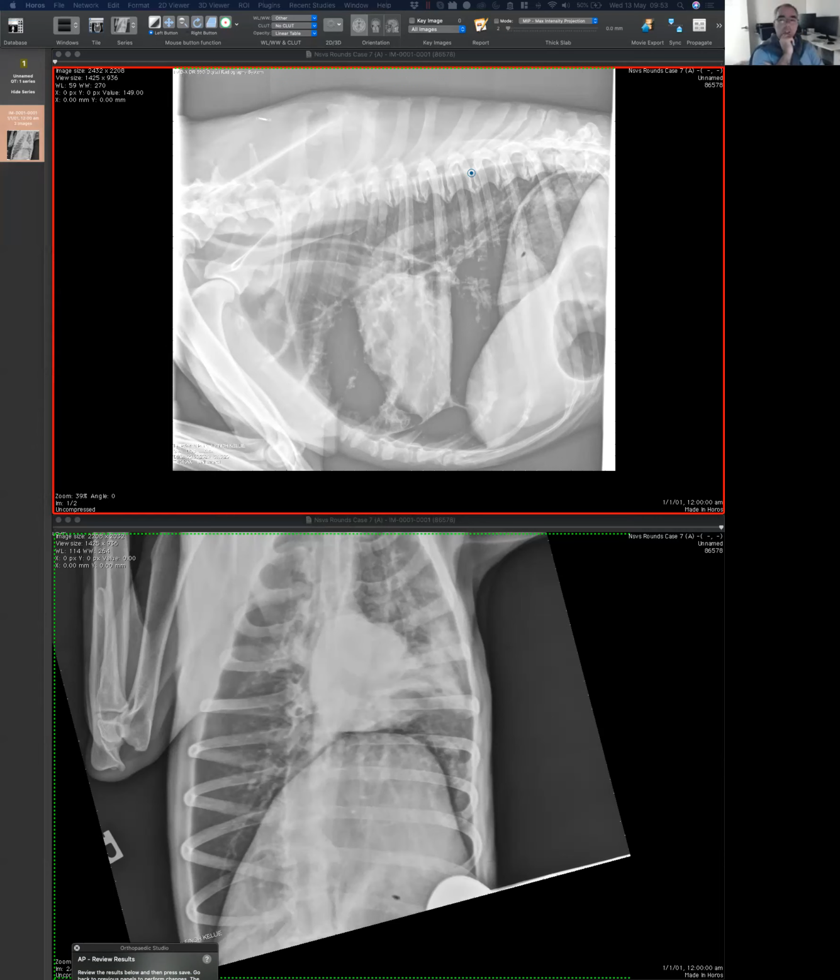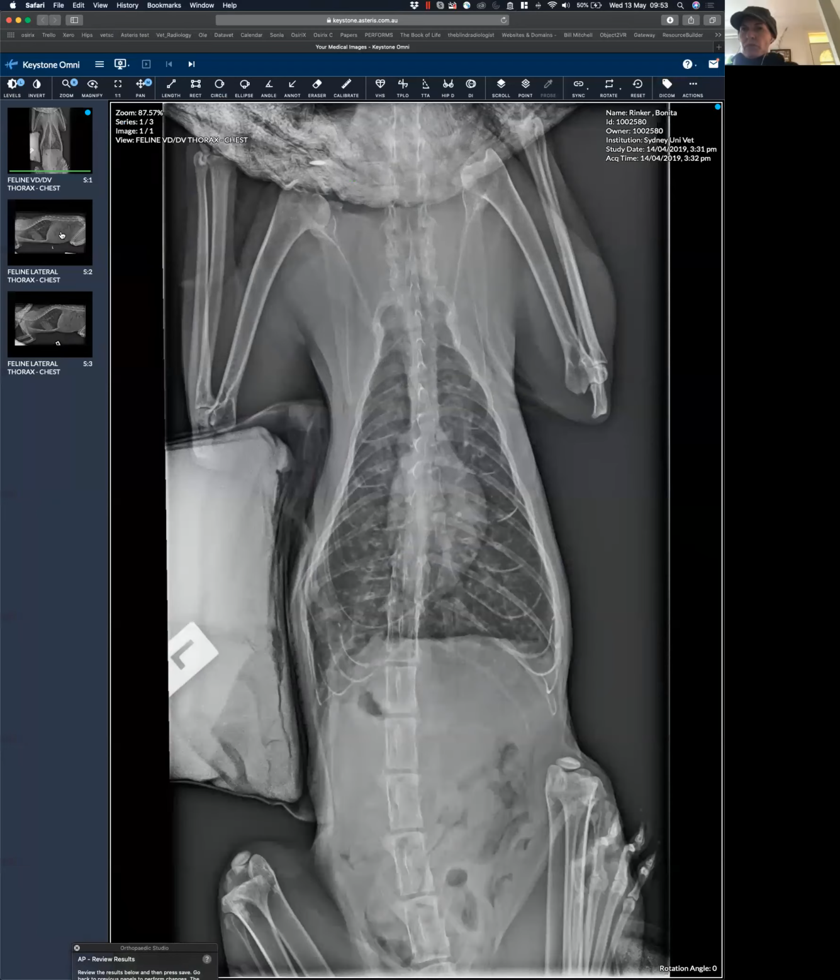More than the word generalized, I will be concerned about at which level are you picking in the bronchial tree? Are you picking the principal bronchi or are you picking a peripheral bronchi? So yeah, the little ones. You need to pick the little ones. Don't come here and say, I see the wall of the airway there. You will always see it. That's not abnormal. I show you, just lucky, I got the mother of the bronchial patterns.